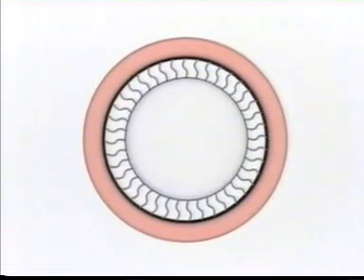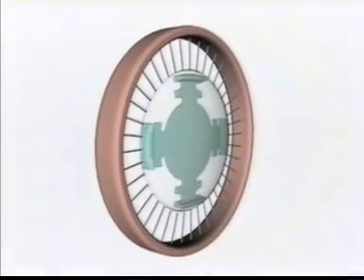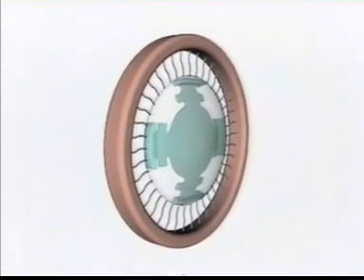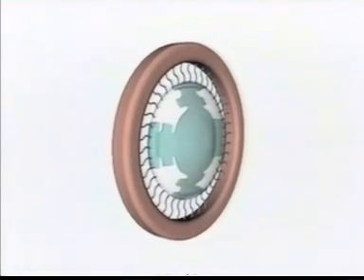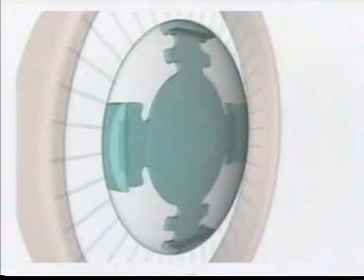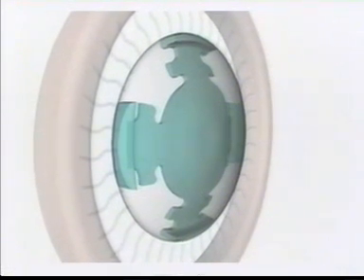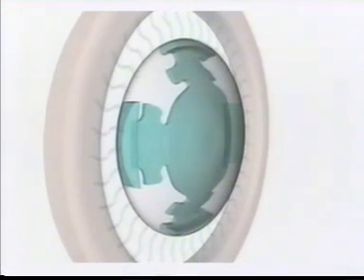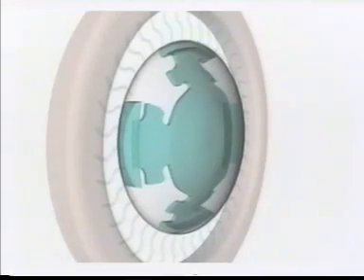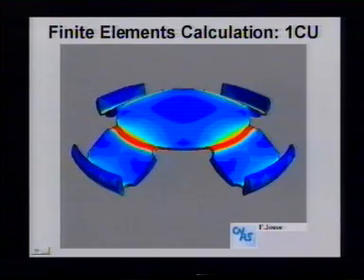The relaxation of zonular fibers leads to a relaxation of the capsular bag. This relaxation leads to an anterior motion of the optic via a hinge at the optic-haptic junction of the four haptics. The haptics rotate anteriorly and thereby relax the hinge area, thus resulting in an anterior movement of the optic, as can be seen in the computer simulation based on finite elements calculation.